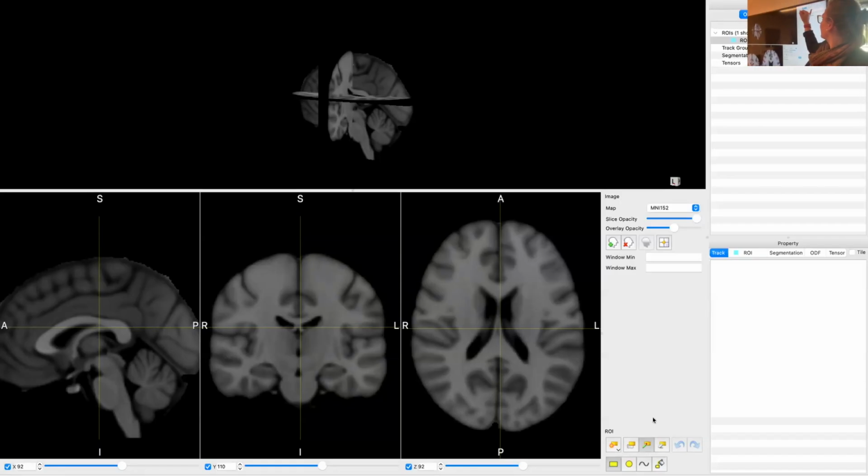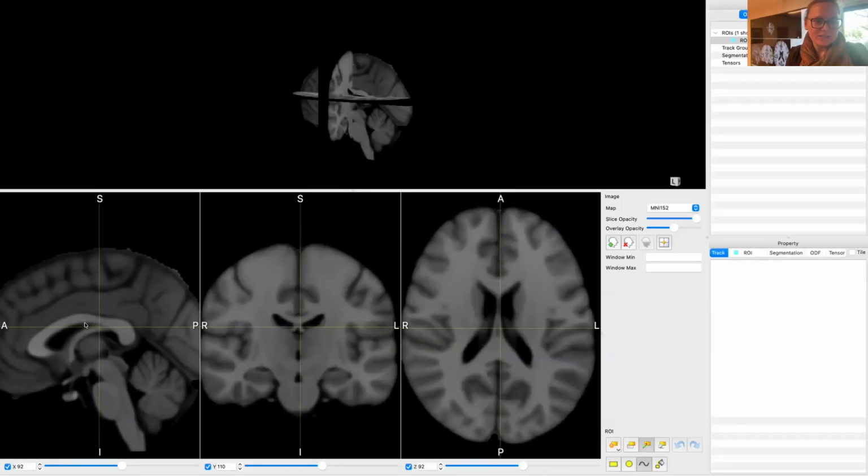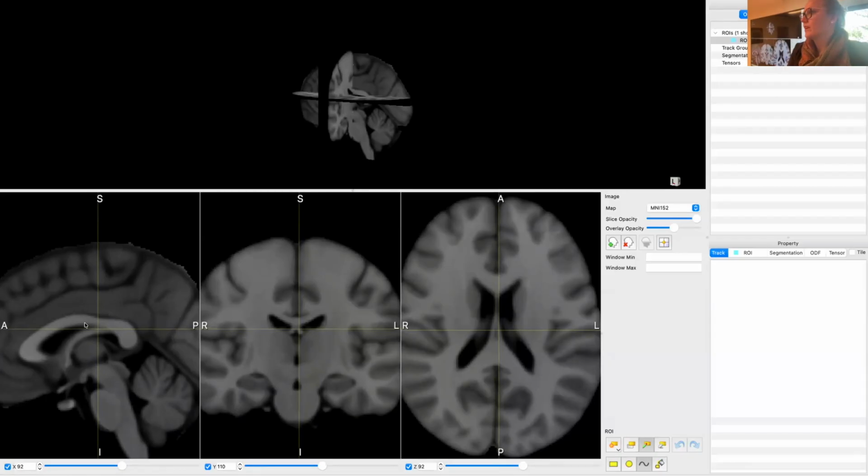Number 1 is you now see in the overview your first region of interest, and it automatically unlocks this menu where it selects the pen and the box. Now we want to change from the box to the wiggly line because we freestyle our drawings. So change it from the box to the wiggly line by just clicking on it. Okay, now it's time to do some drawing.